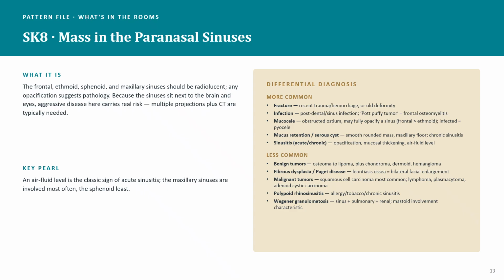Now, sometimes the most common cause of this filling effect or this white cloudy appearance is the patient might have something called sinusitis, and with that we're looking for, on the x-ray, an air fluid level where we can actually see a line between the air and the fluid. That is a classic sign for the radiologist or doctor to say that the patient might have acute sinusitis. Now, trauma can also cause blood to collect in the sinus, and also things such as cysts and tumors, which are less common, they can cause the sinuses to look opaque on the radiographic image.